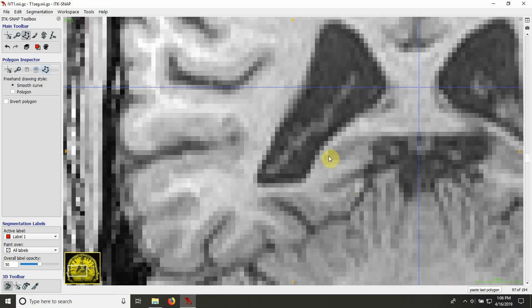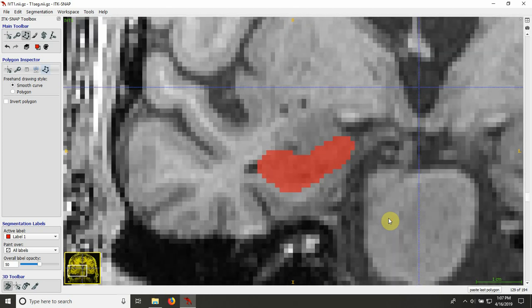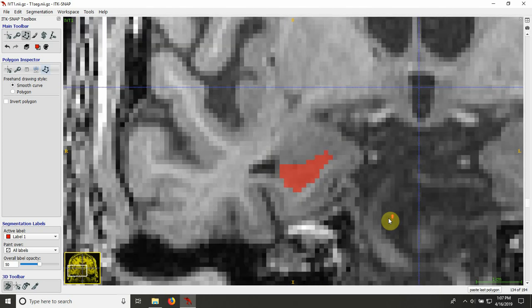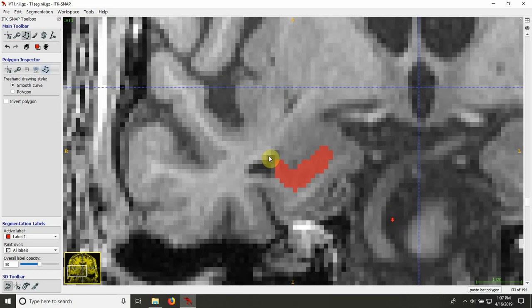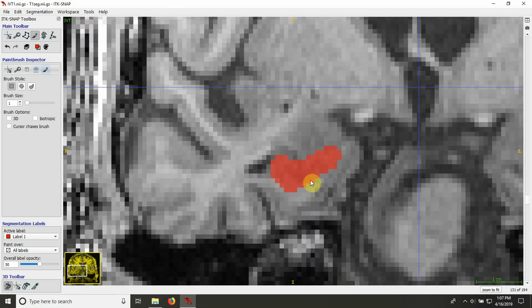And then I think I only see this line here. I think that's it. So now I'm gonna go through my segmentation and see if there are things where I can improve it a little bit. I won't take too much time because I think it's more important to start looking in the sagittal plane, but I just want to touch it up a little bit.